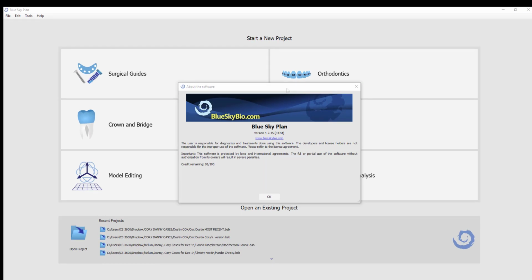Now this is something I think you'll really like because most of the bugs that were plaguing previous versions have been fixed in this one, so things like overextended bases, teeth moving in a weird manner, all of those things have now been fixed, and we've also created more of a wizard workflow that leads you through the steps so that you're not jumping around to so many different panels to achieve the results you're wanting.